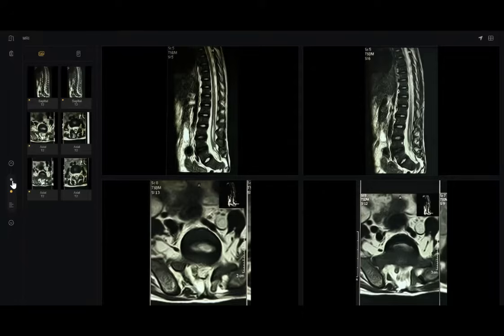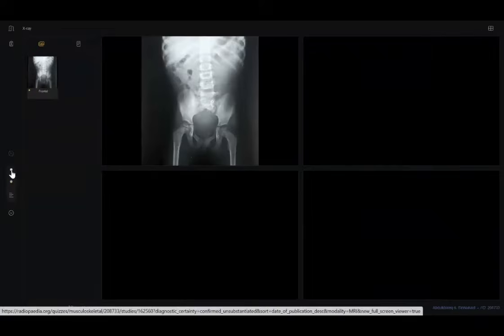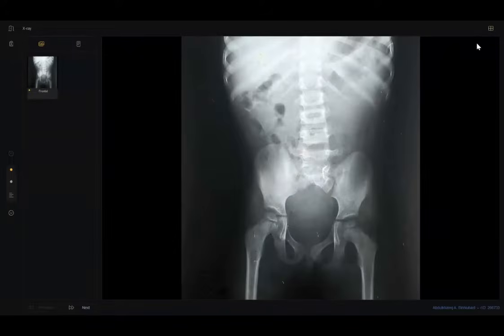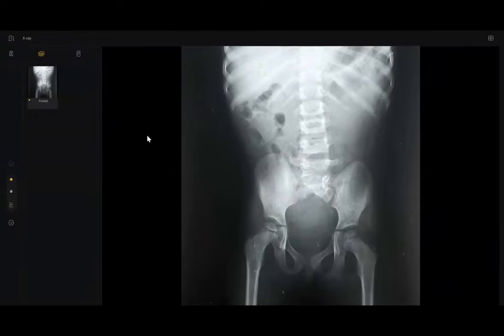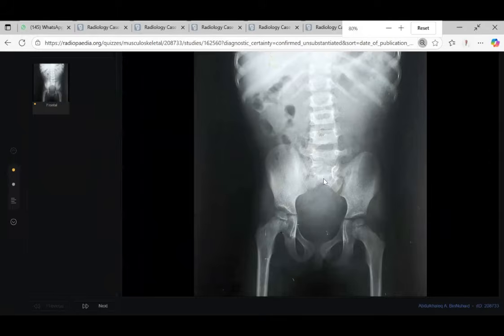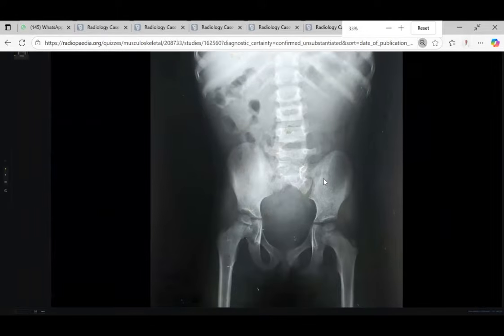Very well. This case has multiple syndromic findings. What happened here? I think the examiner will not give you a good history. He may tell you it's a routine checkup. Why? Because if I told you the actual history, you would answer immediately: if the patient has neurogenic bladder, paresthesia, you will go to the spine and rule out spina bifida and the related spinal vertebral column anomalies.